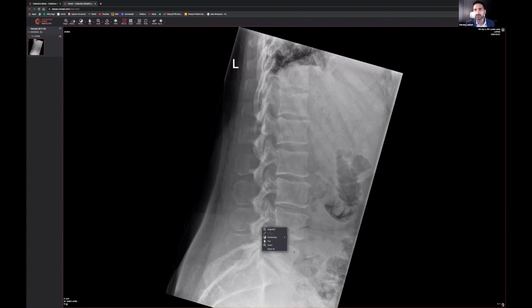And the other thing to do, once you've told yourself, okay, the vertebral heights look okay, the intervertebral heights look okay as well, is to check the alignment. The way to do the alignment is literally just to draw a line going along the posterior aspect and the anterior aspect. Sorry, I've done a terrible drawing, but you can see that everything's actually kind of aligned, right?